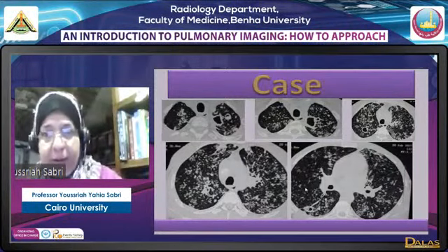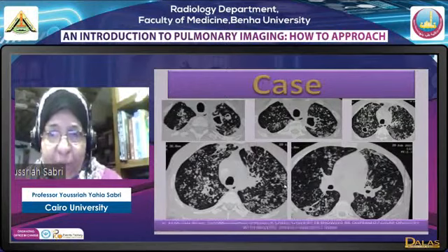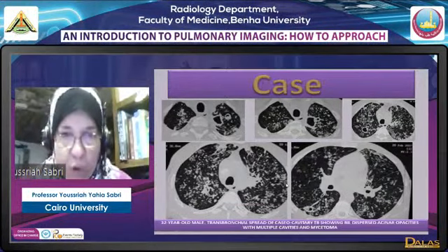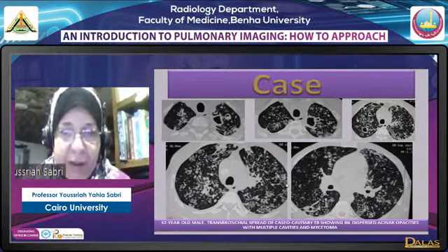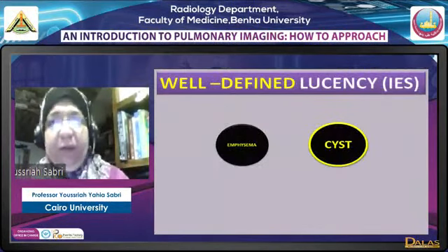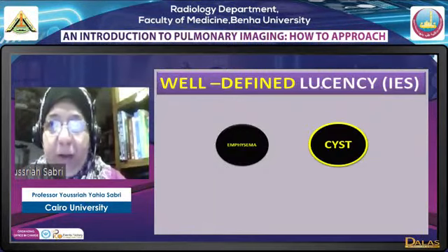And this is actually a case of tuberculosis with transbronchial spread and what we call pneumonia, tuberculous bronchopneumonia. These are acinar opacities, acinar nodules. Now, finished with the well-defined rounded opacities, let us shift to the well-defined lucents.